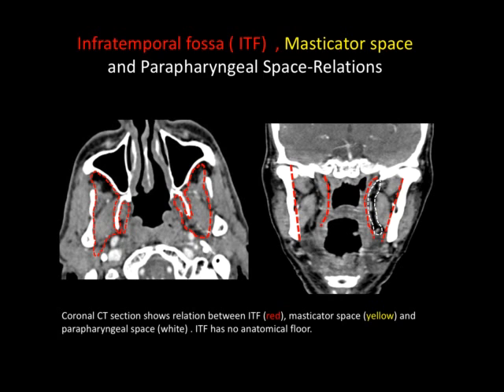My take on this is that disease is not black and white. It does not end there only. When I see a bulky temporalis muscle, it doesn't end where my eyes see it; it has a margin up and down. So if the coronoid process is involved, I'm coming to that in the next section. This is on the coronal section, showing how it is in the boundary.